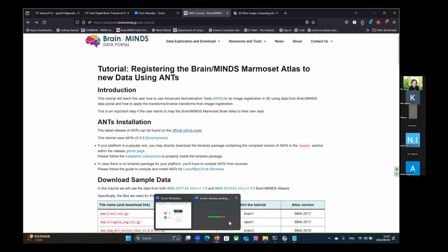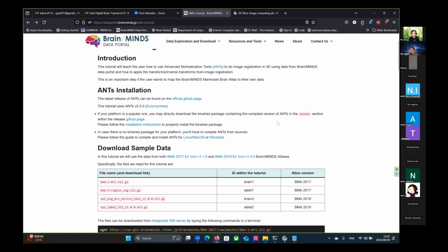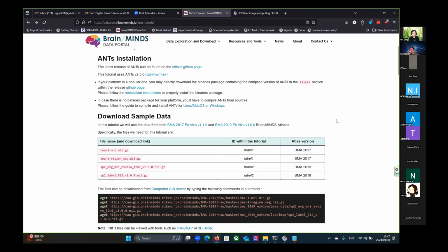Makes sense. No, for now, I believe it's okay. Thank you. Okay. Any other questions? Okay, then I have a question. Here you said that you only use a simple parameter for registration to save some time. Could you tell me some tips about how to explore parameters for registration to obtain better results?